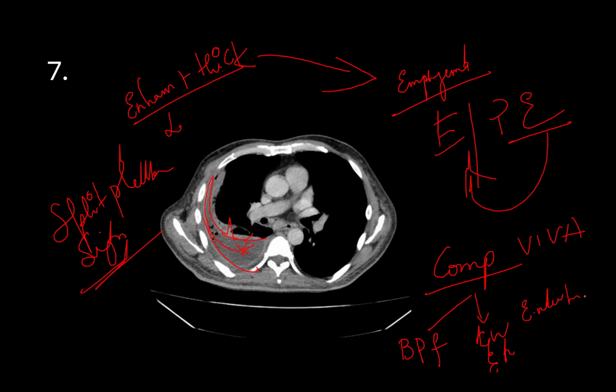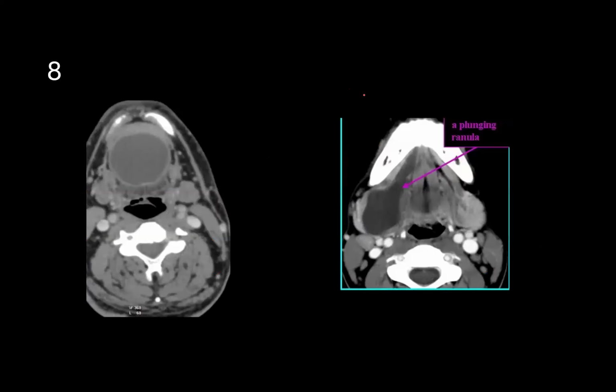You might have heard this, and it's a spotter also. There will be a collection like this. It is connecting with the chest wall. So this is empyema necessitans. Later on, it can form sepsis, it can become fibrothorax, etc. And what is the management? Is it only by draining, by putting an ICD? No. Surgery should be done and it should be drained, because otherwise it is not going to decrease.